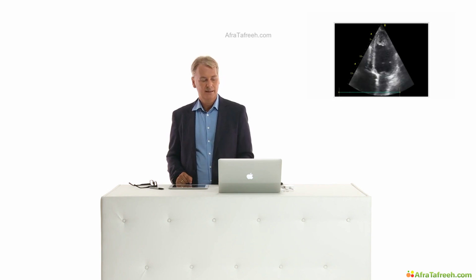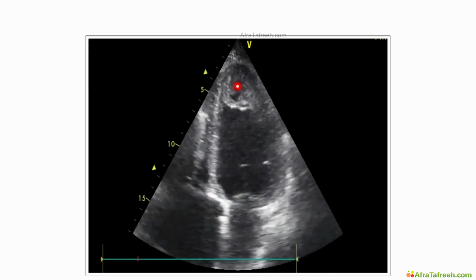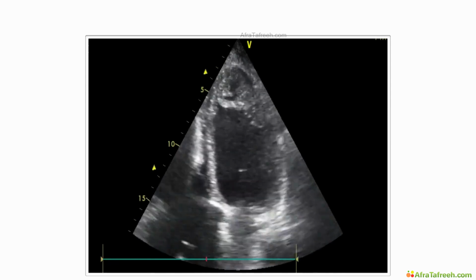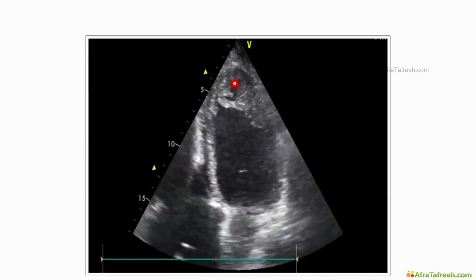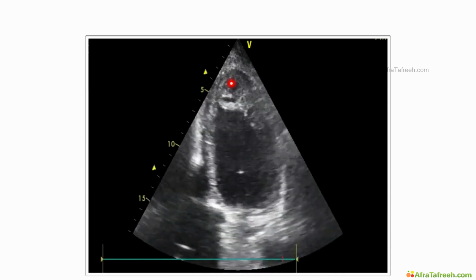Here, in this case, I think it's also quite clear. This must be a thrombus. Take a look. You have echogenic areas and more echolucent areas. This is something you see quite frequently in thrombi. It means that parts of the thrombus are forming or dissolving, while others are starting to organize or are more dense. In any case, very frequently you will see a little bit of a different echogenicity between the thrombus and the myocardium.